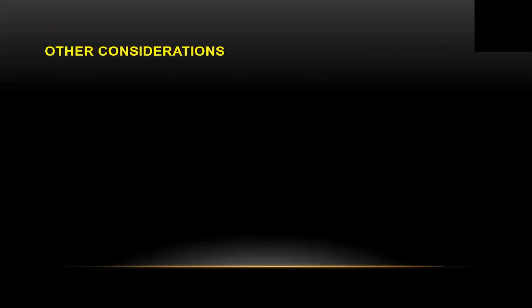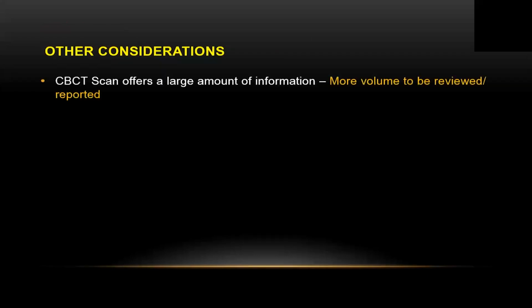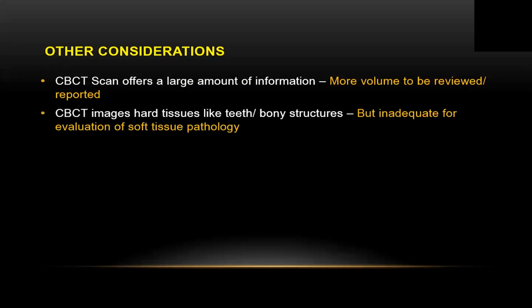Some other considerations that we should keep in mind when we are talking about airway and cone beam. Cone beam is offering you a large amount of information, which is an advantage, but also that means we have larger volume that you need to review, look at, make sure there is nothing else going on the scan.